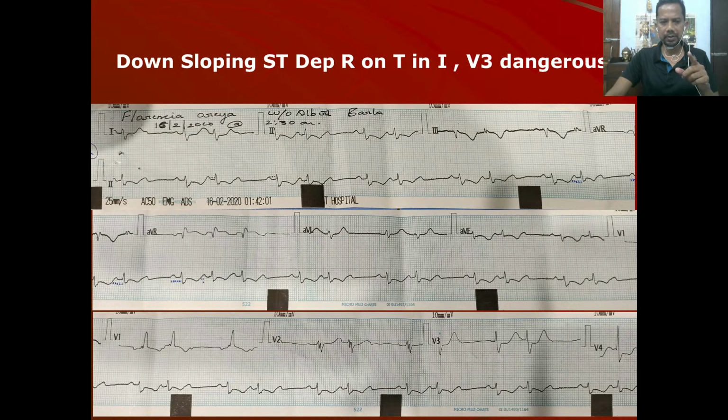You have to pick it up, because this can start a very fatal ventricular tachycardia. That impulse is happening when the myocardium is totally vulnerable, and suddenly a VT starts. So this is R on T. The T wave is ending and R has fired.